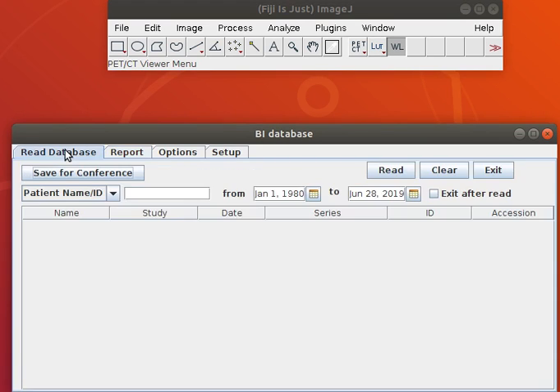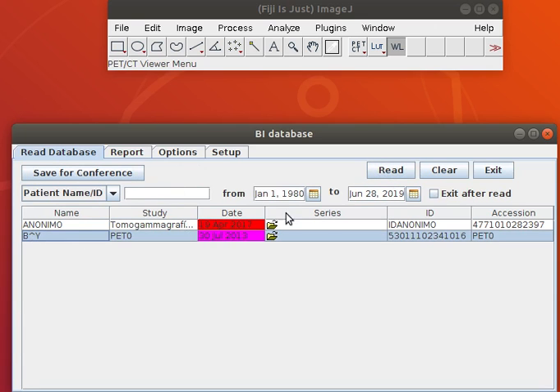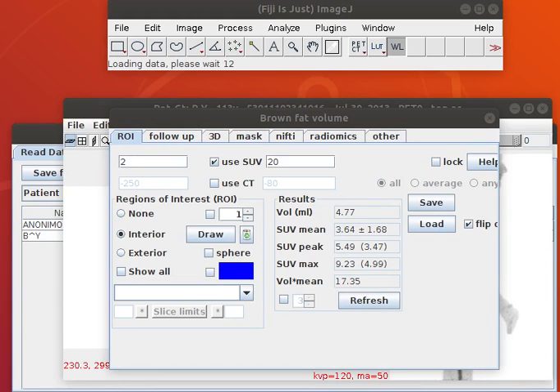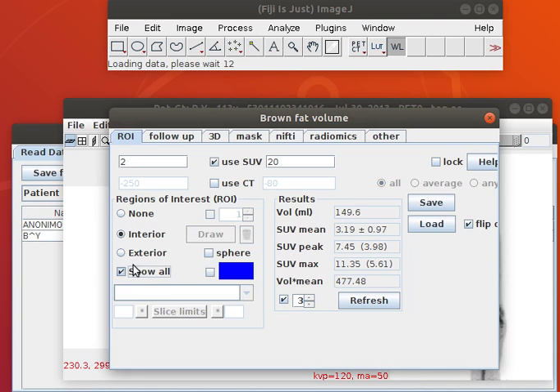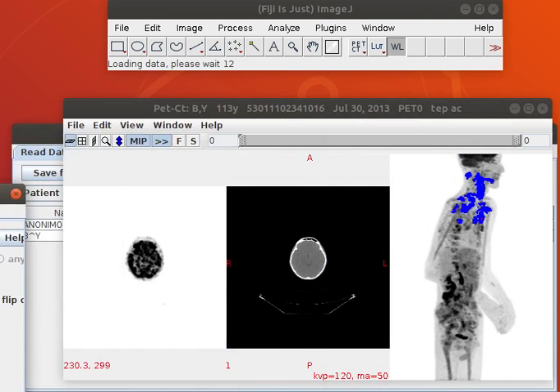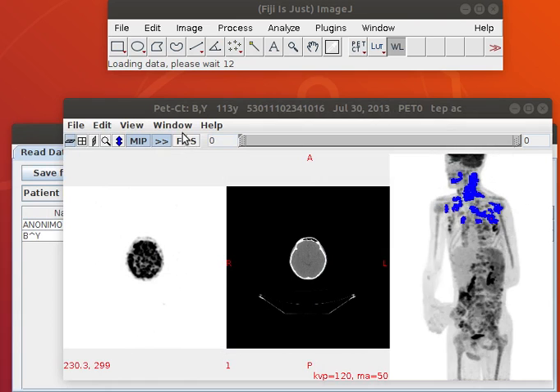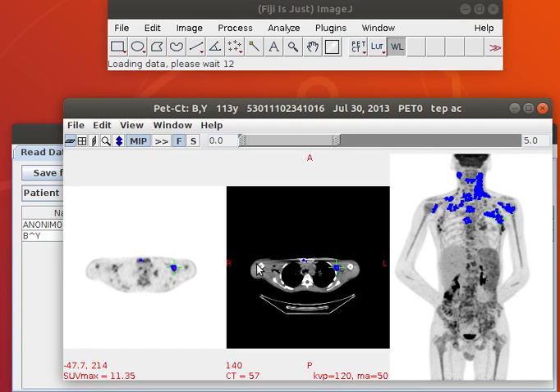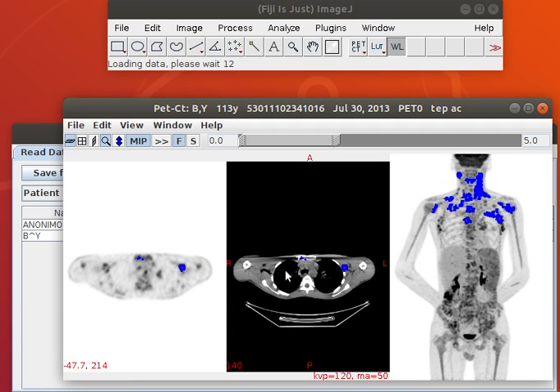Okay, now the next thing I'll do is bring up something to read. I bring up this study, and I'll pause it. Okay, the images have come up. I want to look at the little dots. Turn this on. There's my rotating image. And I want to look at some particular slice. I might just as well zoom this to make best use of the available territory.